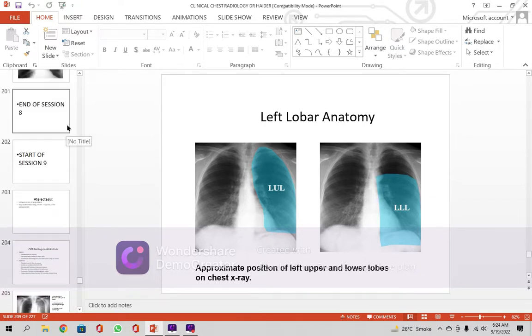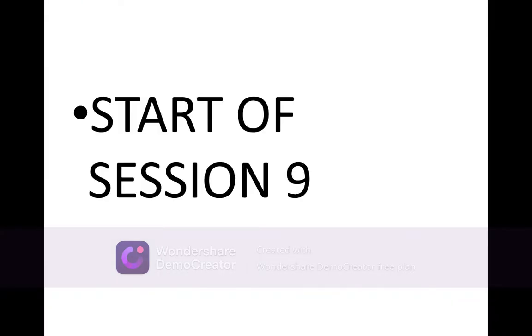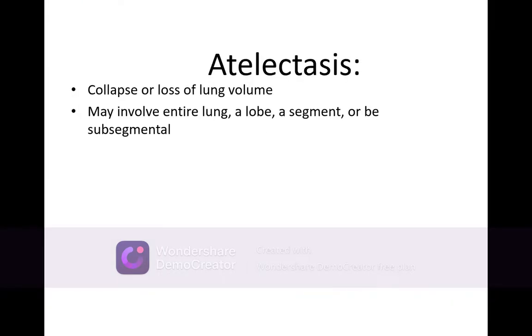It is session number 9 of the clinical chest radiology, plain X-ray radiology. And the topic of today is atelectasis, which is a difficult topic to discuss as far as the students are concerned. As postgraduates, not a problem.